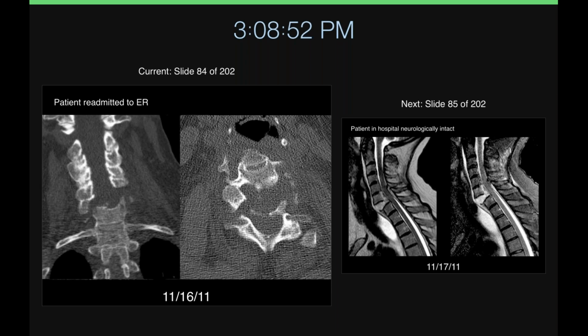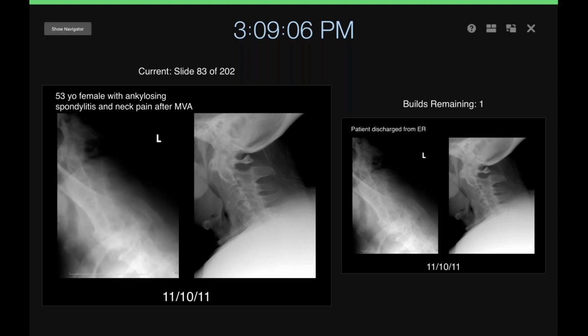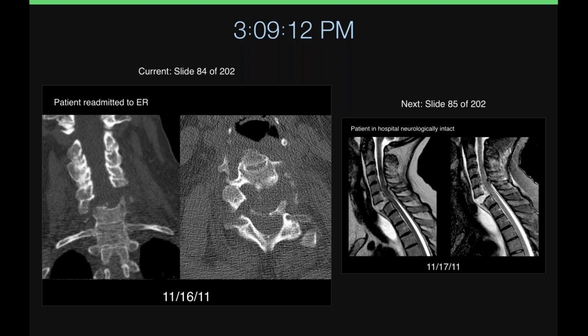Come over and look at that. The X-ray. I just kind of want to see the X-ray now. Do you mind? Sorry. Sure. Come look at the X-ray. It's a swimmer's view. Thanks. Okay. And then, so there, so we can see that.